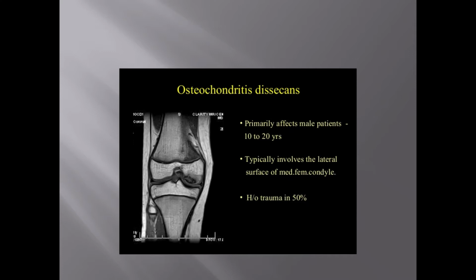There is a condition called osteochondritis dissecans. This is a joint condition in which the bone underneath the cartilage dies due to lack of blood flow, is commonly related to trauma and is more commonly seen in children and adolescents. The area of the bone which is affected is low signal here. Now, in this patient the superficial cartilage is intact, but sometimes it will progress so that the cartilage and the bone may become loose and will cause difficulty in movement secondary to a loose body.